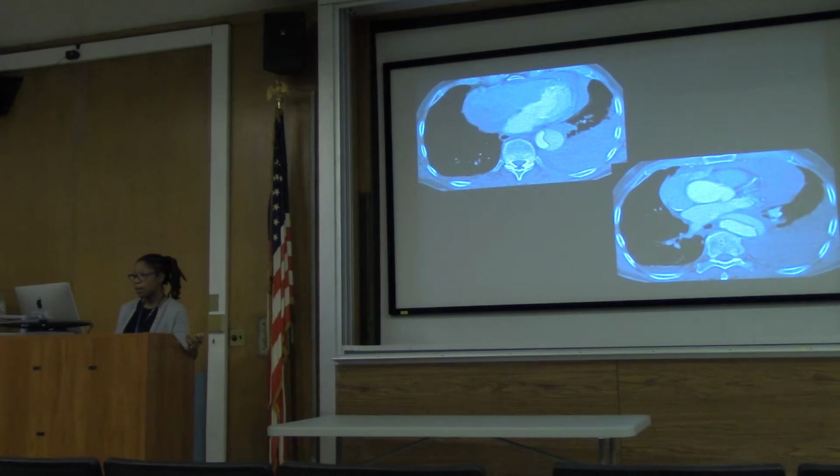In this case here, again, we have aortic dissection. There's some fluid in the pericardium, a small pericardial effusion, but there's a large effusion here, and there's some high attenuation within it. So even though you don't see blood pouring out of the aorta, by virtue of the fact that you have pericardial effusion and a high density left pleural effusion, you have to be concerned about rupture.